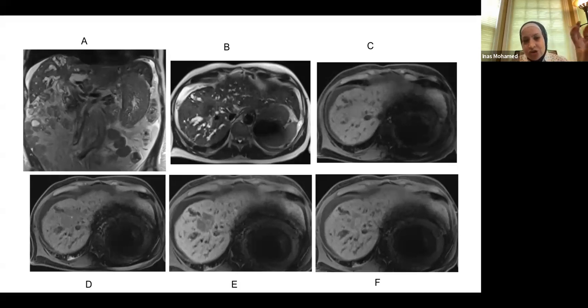The ones with very delayed enhancement, even without bile duct involvement, you have to put in the differential. But this one is full-blown cholangiocarcinoma. That infiltration of the bile ducts grabs your diagnosis.